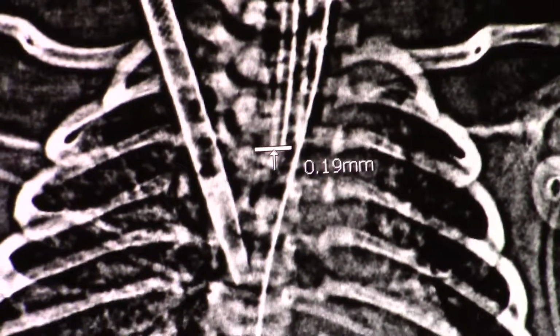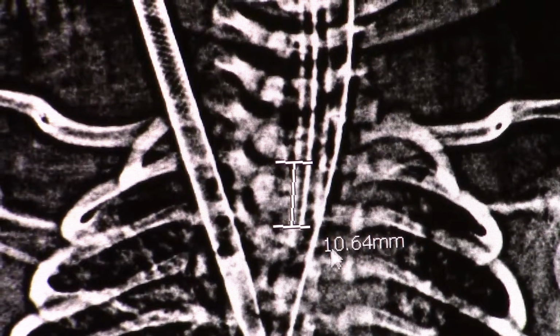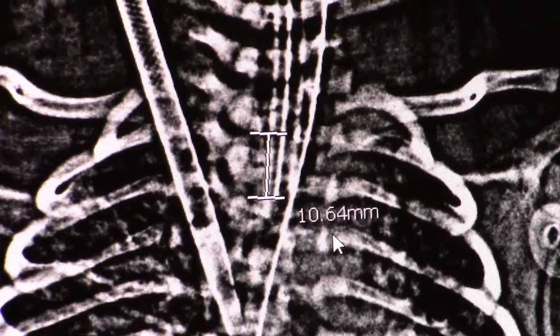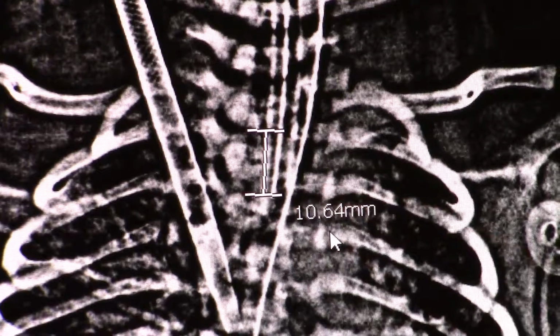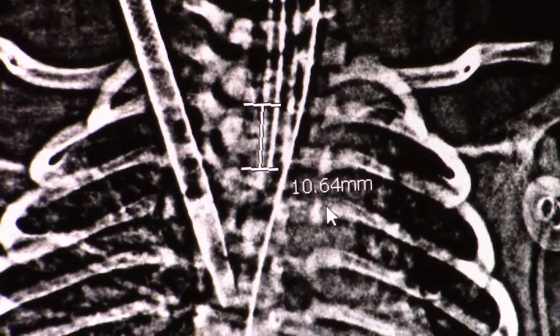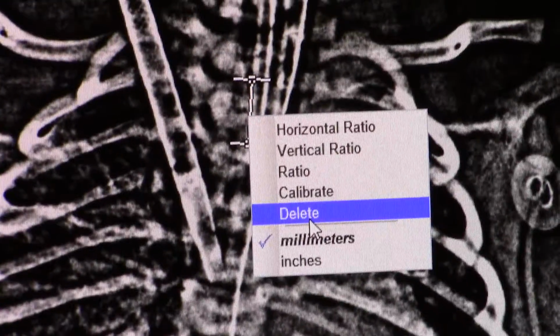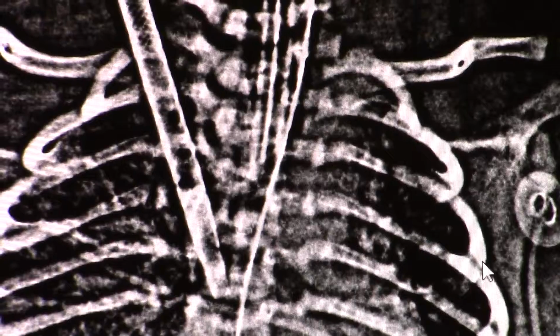He wants to move it to the bottom of T1, so I go up to T1 and I'm going to say, in the neutral position, I need to move it by 1 centimeter to get it at that spot in the neutral position. So this measuring tool is really useful and helpful for moving tubes in accurate increments.